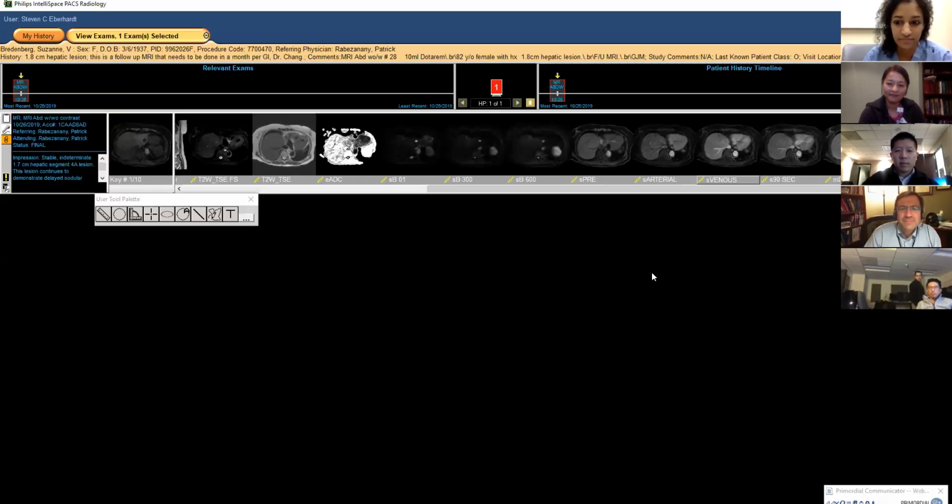I don't recall, Artie, if the ones that you showed before were not very T2 bright anymore. Actually, I just showed some of those at RSNA, but basically one of the patterns is that they lose their T2 brightness, but another feature is some of them can become really, really T2 dark. And that's pretty unusual for a malignant tumor. If you see that, I bring it up even more that this could be a sclerosing hemangioma, because it's a combination of fibrosis and some will have little cystic spaces left, maybe trapped old blood products like heme and fibrosis. The T2 dark areas tend not to have that nodular enhancement, so you can have a combination. It can be sclerosing, and then you can have a fully sclerosed one that's just fibrosis.